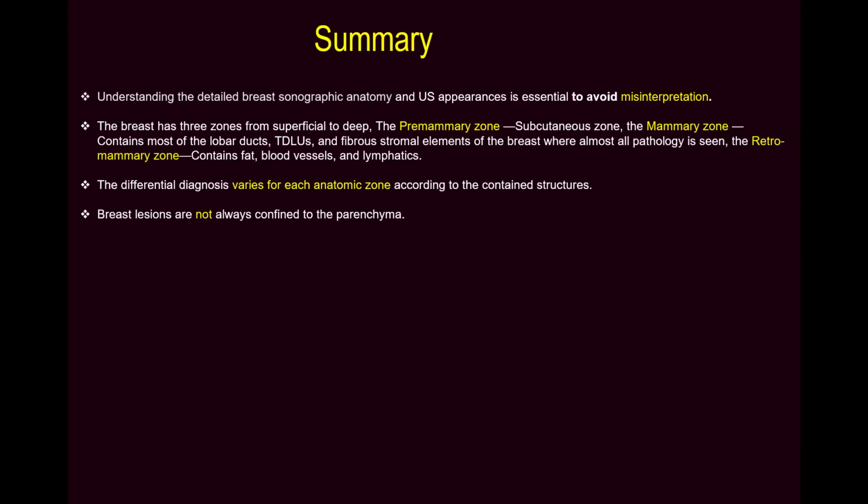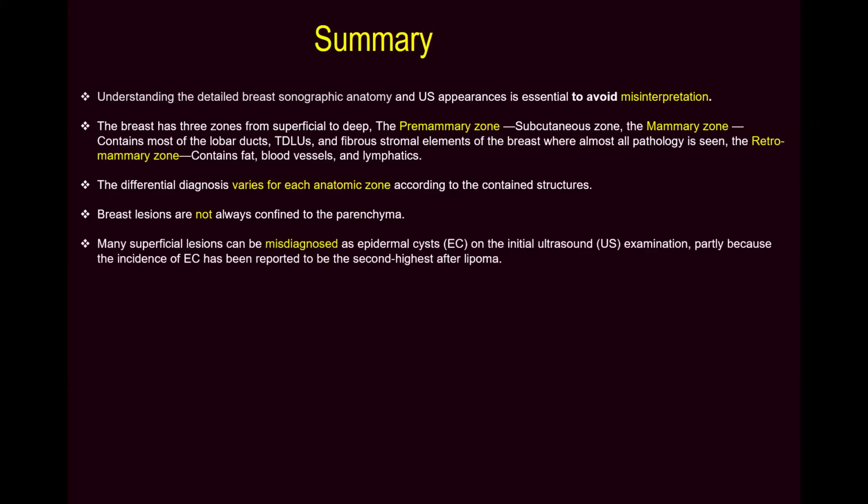Breast lesions are not always confined to the parenchyma. Many superficial lesions can be misdiagnosed as epidermal cysts on initial ultrasound examination. Why?